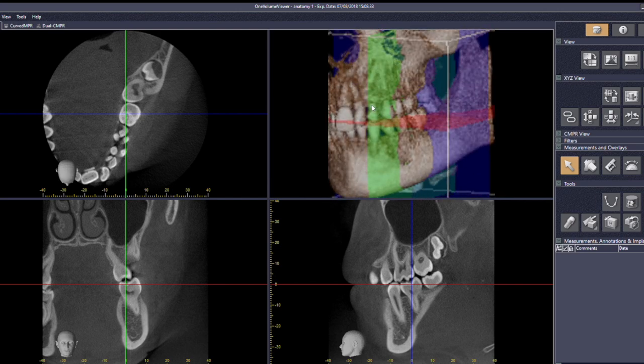When we're on the coloured lines, let's look at these in a bit more detail. In this picture, you can see we've got a vertical and a horizontal, and again, apologies if you're colourblind or struggle to see, but the colours of these lines, they're not green, neither of them. In this image and this image, we have a green line. That means that this picture is this green line. So whichever colour you cannot see, that is the picture. This green line here is this picture.